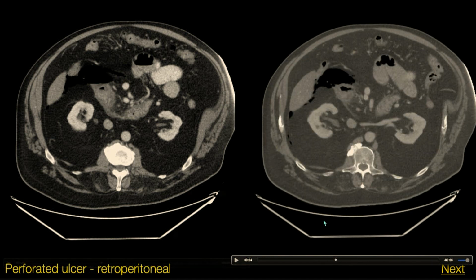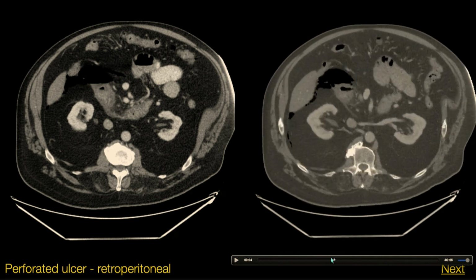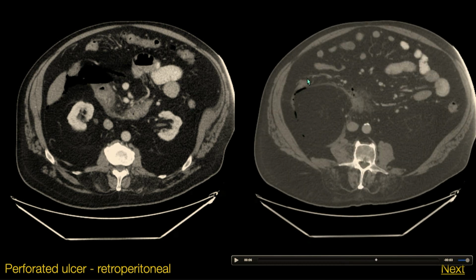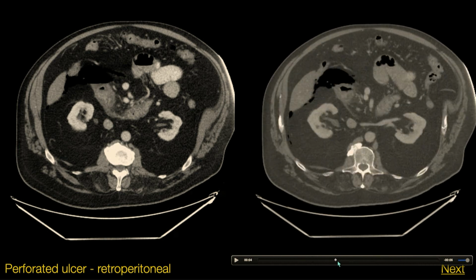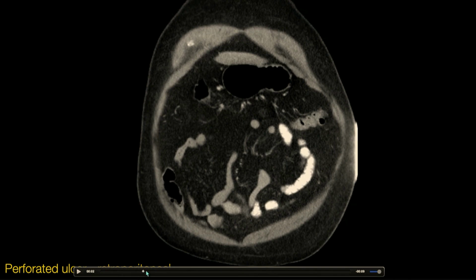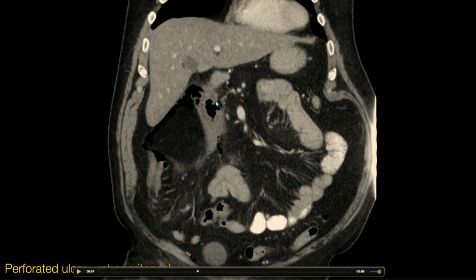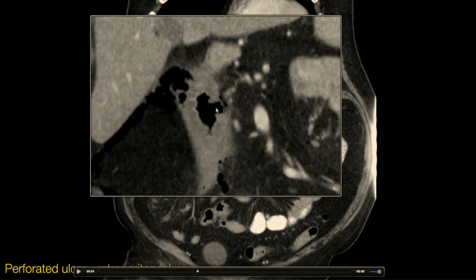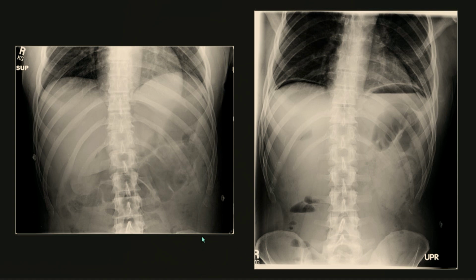So I think when you're encountering pathology in different planes like this, it can be really great to take a moment and think about, okay, anterior pararenal space, and what I'll look at is actually pushing up on the colon. So just kind of helpful seeing that, appreciating those anatomical planes. And the ulcer defect is best seen on coronal here. It's right there along that medial margin. So there's that ulcer crater. All right, so that covers the second portion of the duodenum ulcer.